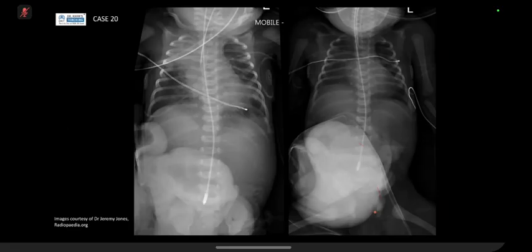Yeah, sure. This is a frontal radiograph of a neonate. I can see multiple lines. There are some lateral cardiac lines, which are at the left apex and also at the right parasternal area. And then one line at the midline, up from the cervical spine until the lumbar spine. I am not very sure what line this is.